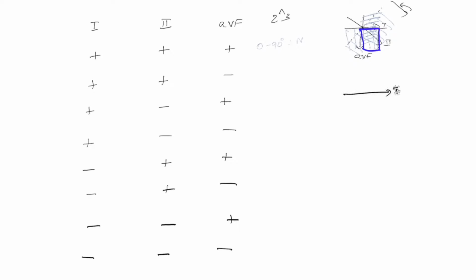So you have 1, AVF, and 2. So given that 1 is positive, you would expect the wave of depolarization to be somewhere here.